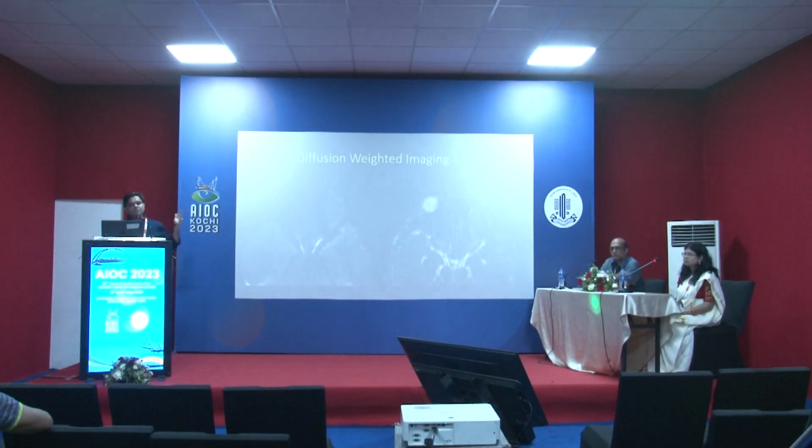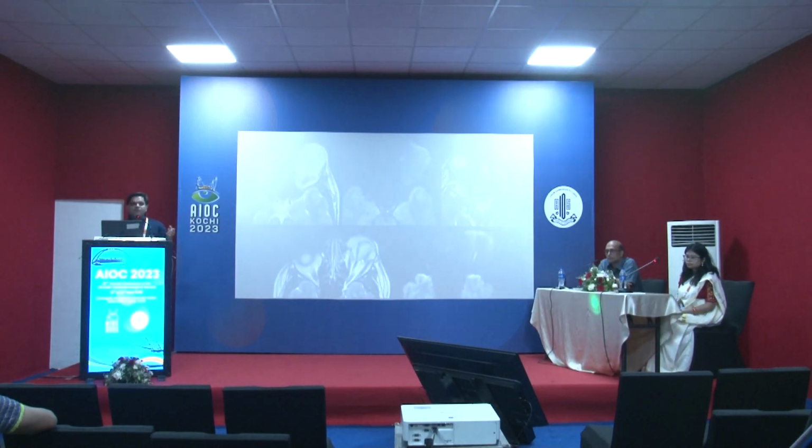very commonly misreported by radiologists only as hemangioma, because we don't have that knowledge that embryonal rhabdomyosarcoma is common in children. And if our ophthalmologist will tell us, then we'll know what to do and how to figure that out. So here you need a dynamic contrast and you need a diffusion.